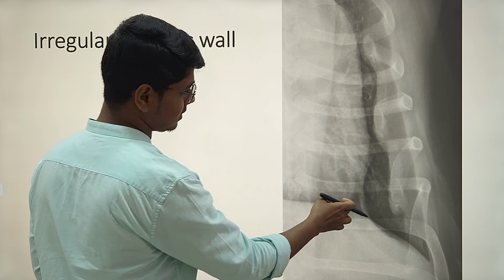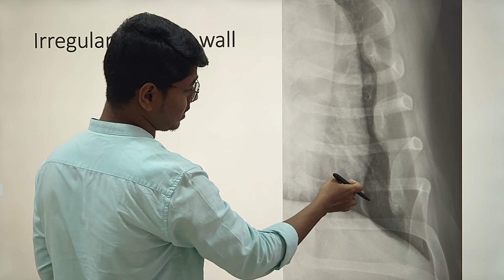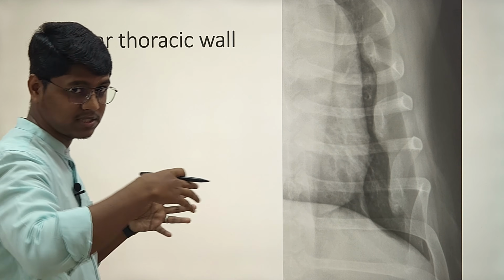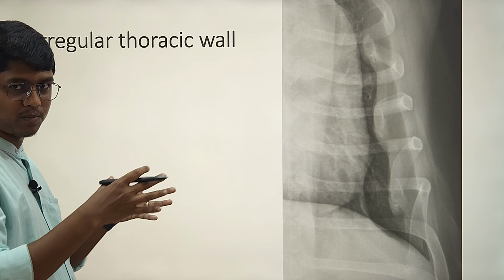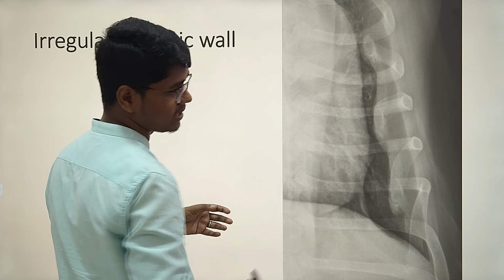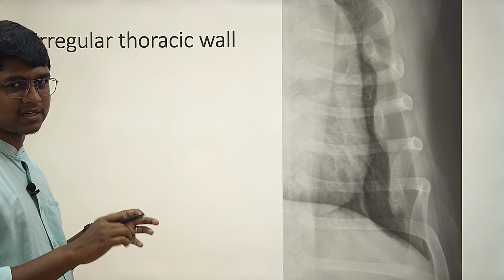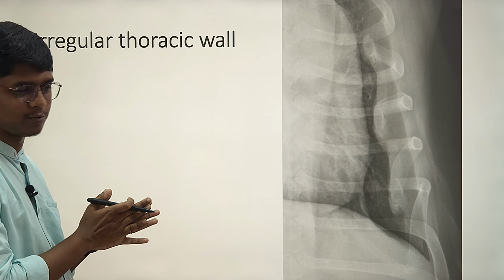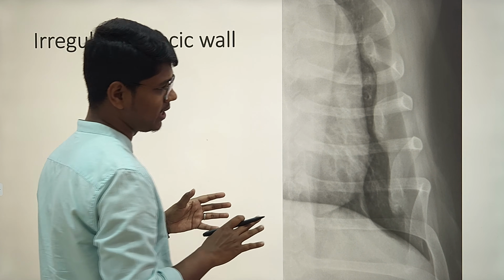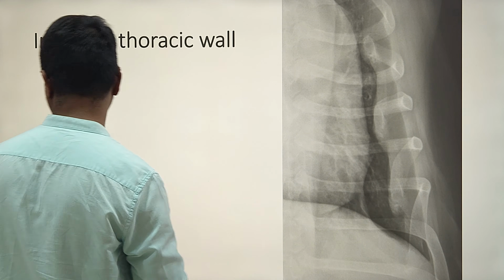And one more thing, the heart here is kind of enlarged. In a deep chested animal, the heart will be covering much of the space. Lungs will be slightly less, especially on lateral sides in mid mediastinum. So it does not also mean that they have some problems with the heart. So you have to be very careful, especially in chondrodystrophic breeds and brachycephalic breeds or deep chested animals.